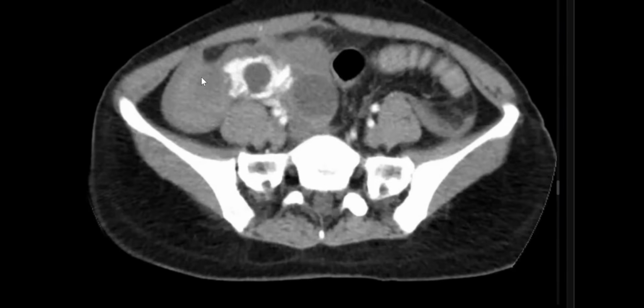So, you can see multiple linear, maybe vascular... My mouse is not scrolling. No problem, no problem. Even if not chronic. You see here in the right adnexa two cystic structures.